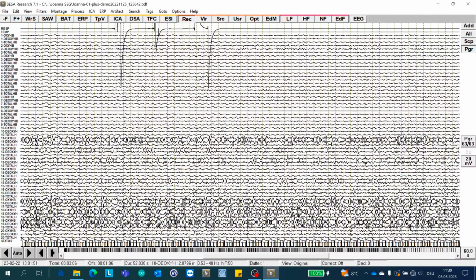Now, having said that, we're not going to do anything to the file. We can run a quick average to show you what that looks like if we presented the trigger. It's a really nice display, by the way. But what we should really do is get a fast track, get the MRI data, which we also recorded of Joanna, and get all the locations of the holders for the NIRS, all the holders of the EEG, because remember, the EEG holders are not in a real 10-20 position on our NIRS cap, the combined cap, because it's not possible because of all these holders.